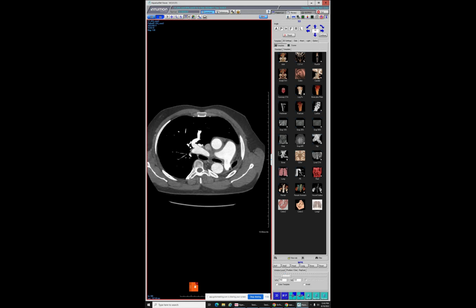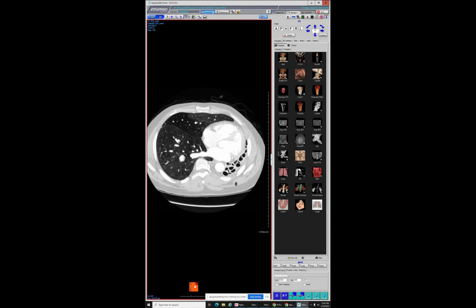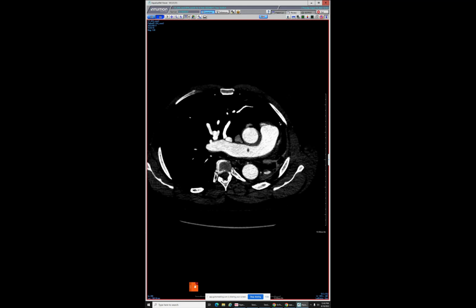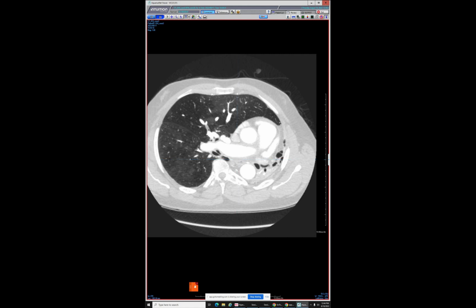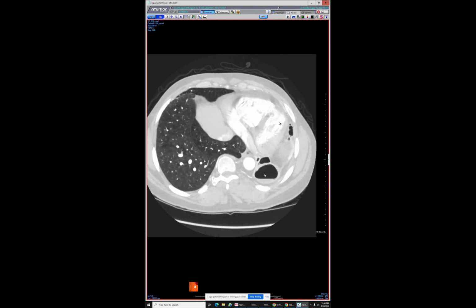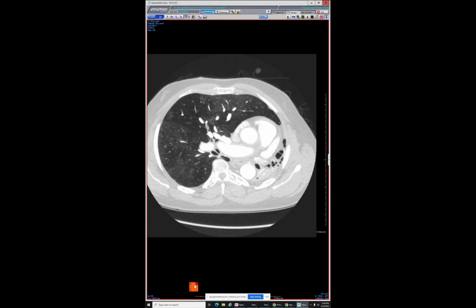I mean, it looks like I've seen people look like this after TB, for instance. It may have been TB. It could absolutely be TB. He has no evidence of calcification anywhere. He wasn't born in this country. His last name is from somewhere in Southeast Asia. And you can see there are cystic areas, presumably bronchiectatic lung, which it is.